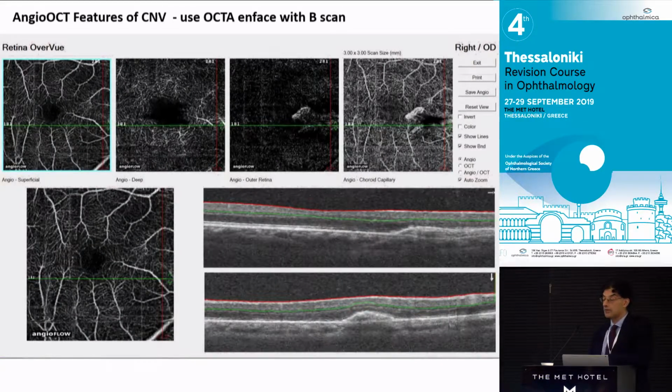Angio-OCT can be very useful to avoid needing a fluorescent angiogram. In most cases, it's a debatable point as to whether you always need a fluorescent angiogram. If you have a patient with extensive drusen, hemorrhage, exudate, and elevation on the OCT, it's not really going to be anything else. But occasionally, I still see patients who have vitelliform lesions who've been injected for a year, and then we've got to have a difficult conversation.